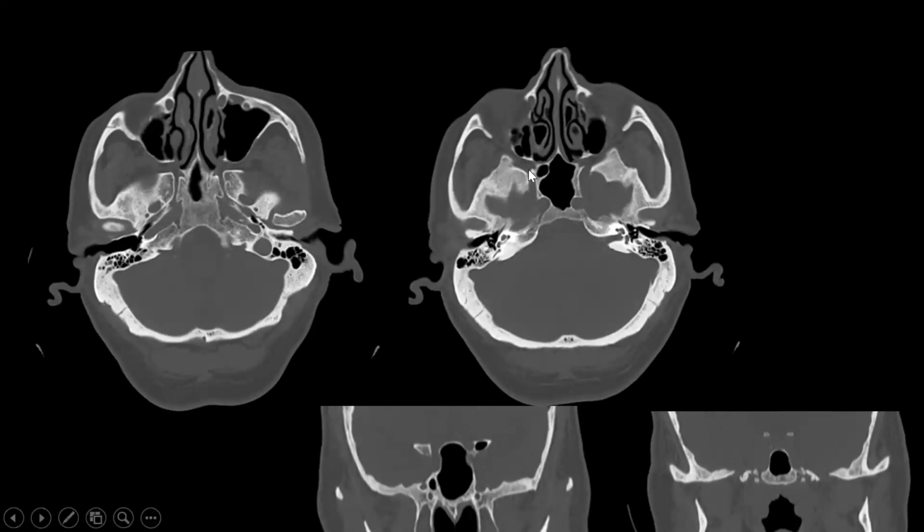I can see the pterygopalatine fossa. Laterally, it is communicating with the inferior orbital fissure and then the orbit. And medially, this vertical canal is the foramen rotundum, communicating with the middle cranial fossa. Just for completion's sake, I'll show how it looks on coronal.